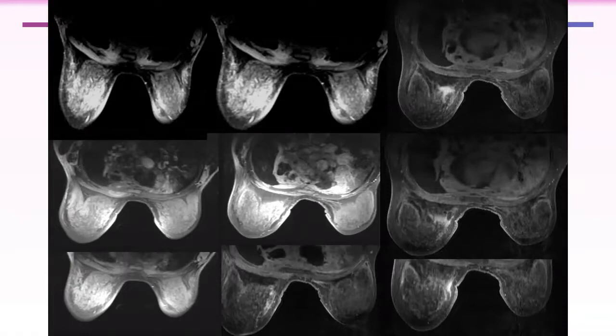What else? Could you see any additional abnormality? Inside the thorax. Excellent, well done. There is mediastinal lymphadenopathy. Excellent. What else? You can see the mediastinal lymph nodes in one image, this and this. And what about this structure? This is lower down.